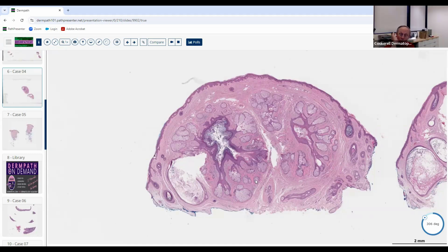So it looks like it's a neoplasm or maybe a hamartoma. And you said at low magnification, it's sebaceous. So it's a neoplasm, and you can tell what the differentiation is, like you've already said, sebaceous differentiation. So your differential diagnosis is already very low right there. You've narrowed it down dramatically.